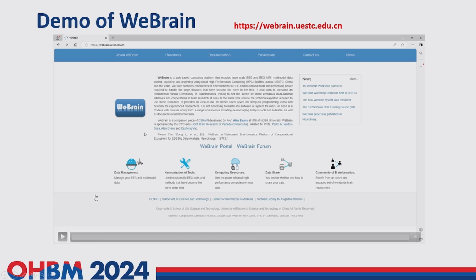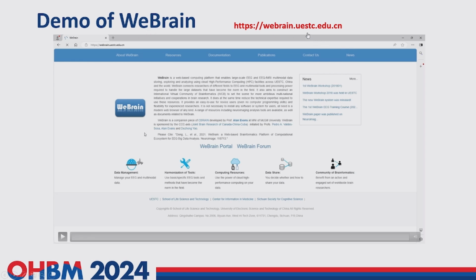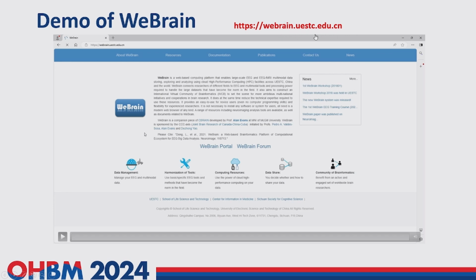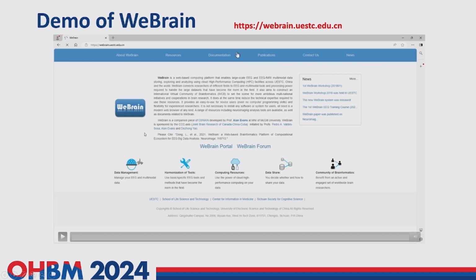And in the next few minutes, I invite you to watch the demo video and see how to operate WeBrain. If you have a laptop, you can open the browser and log in to the WeBrain website here using this address.